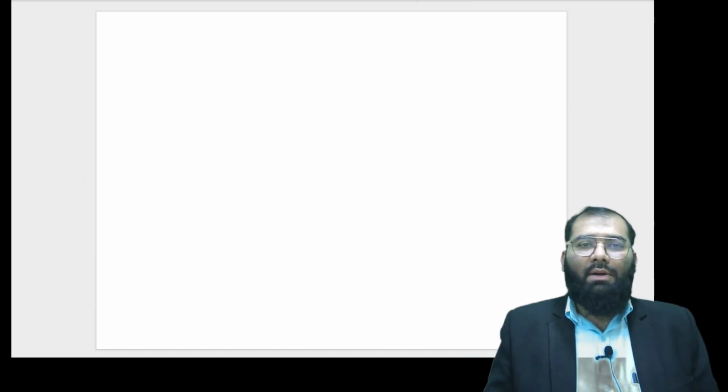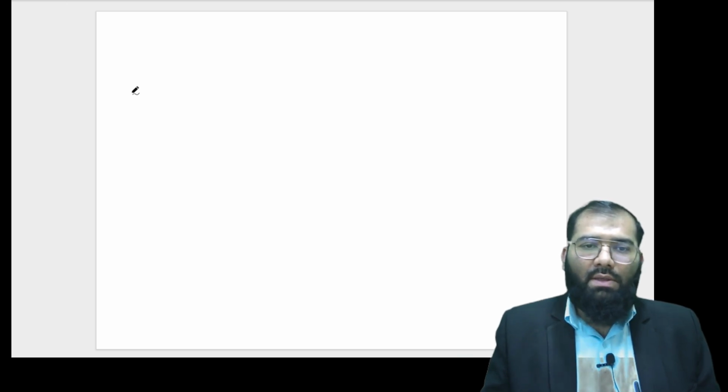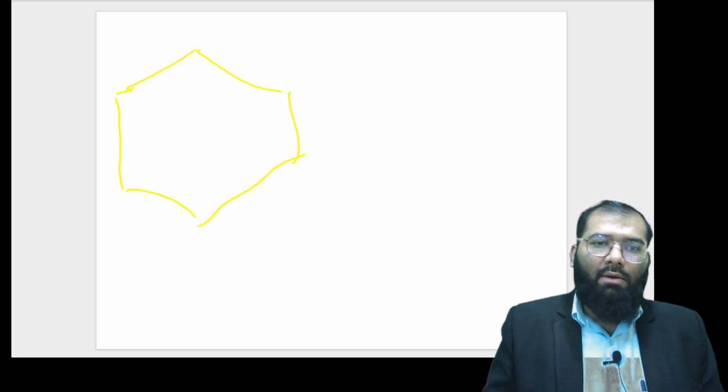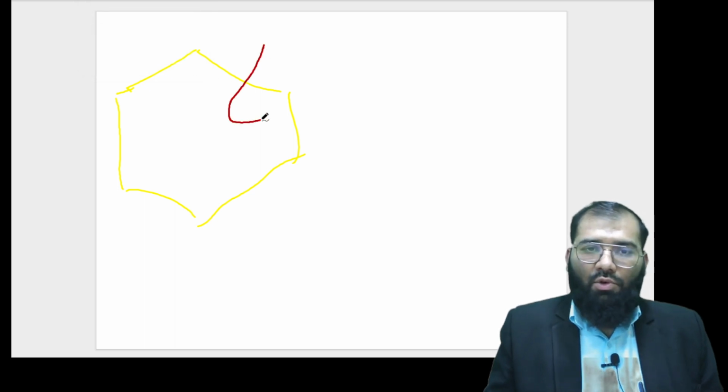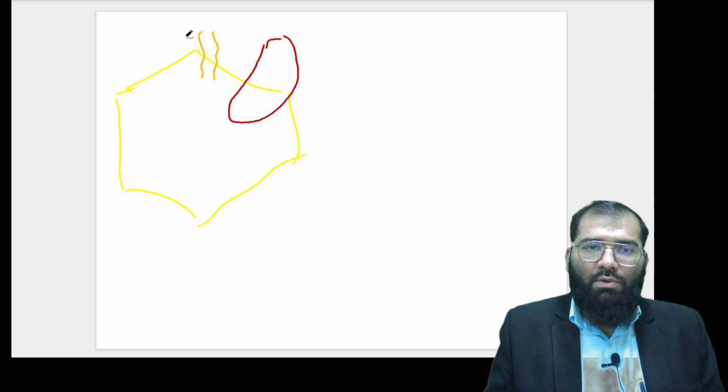Now, out of all of this, the most important thing about the spleen is when the patient comes from the surgery side. The foremost thing when a patient comes from the surgery side where you should look at the spleen is when the patient is sent for esophageal bleed. Suppose the patient is a case of esophageal varices.